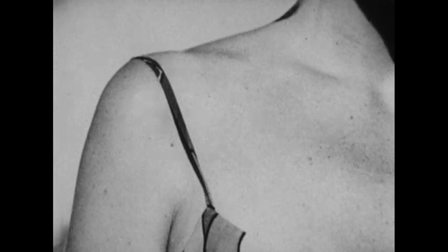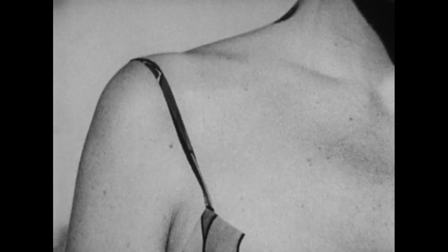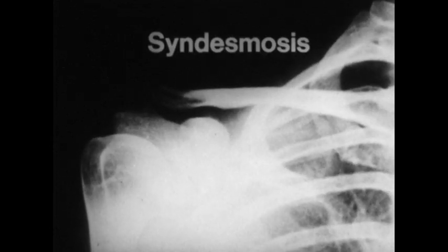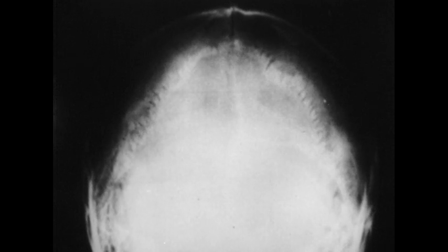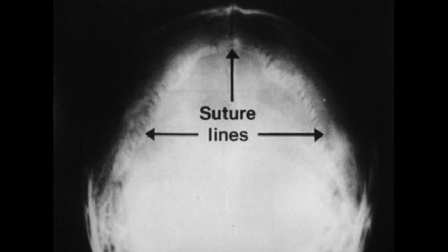A fibrous joint consists of two or more bones united by fibrous tissue. Two subtypes are found: the syndesmosis, where connective tissue of the joint is a ligament or ligaments, as in the coracoclavicular articulation, and the suture, such as the union of the large flat bones of the skull. Here the bones are connected by several fibrous layers.